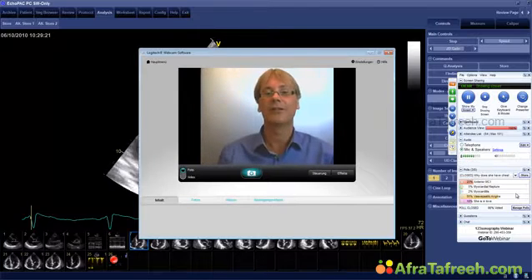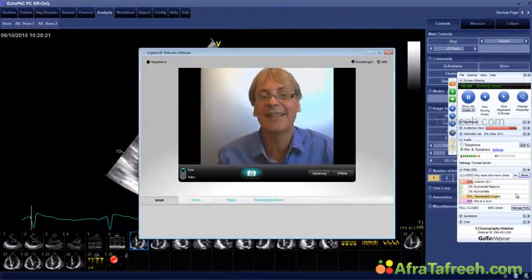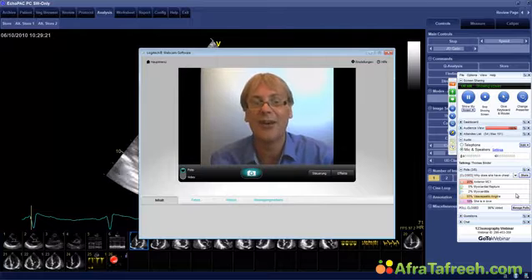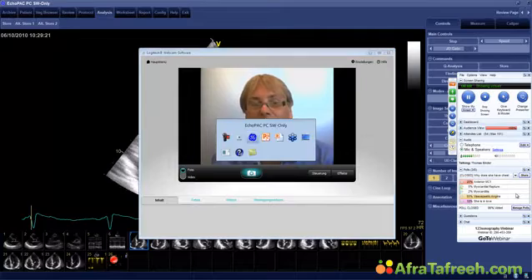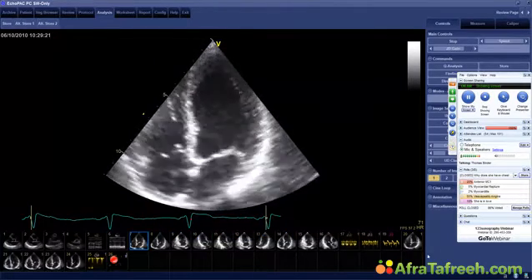Okay, good. And the rest of you think that she's in love. Now, I don't see what this has to do with myocardial infarction or with regional wall motion abnormalities, or do you? Well, let's go back to the echo.